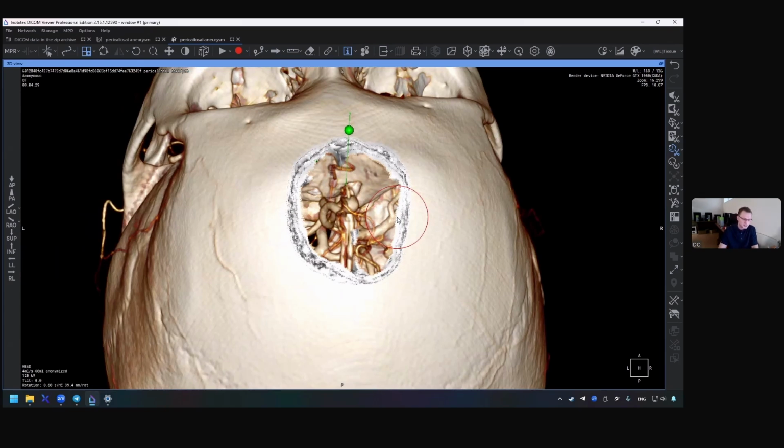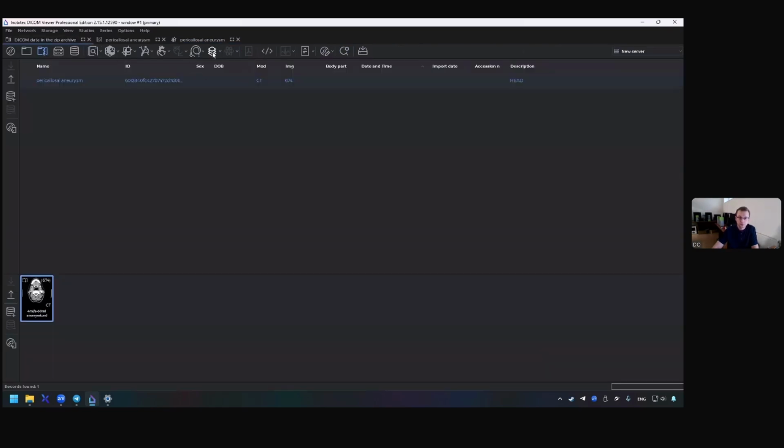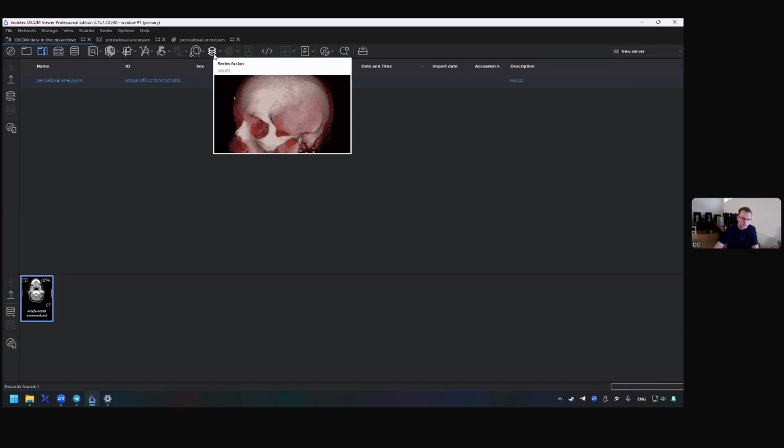Another thing, in Inobitec DICOM Viewer, there is a very useful, very important feature. I mean, of course, layer fusion. With layer fusion, you have the possibility to use several sources for your reconstructions. Patients often ask, for example, what is better, CT or MRI? But we know that CT is not better than MRI, and MRI is not better than CT. In fact, both methods have their own advantages.